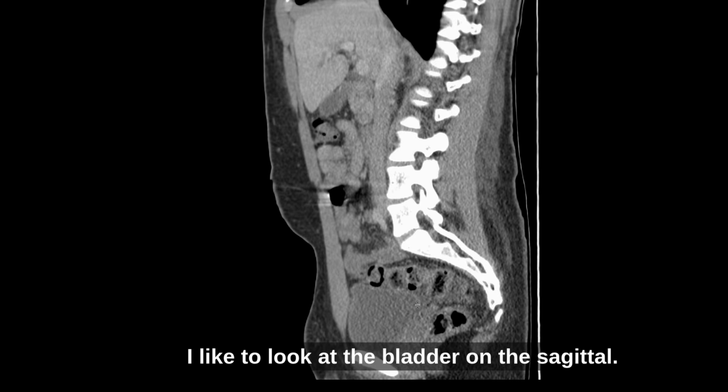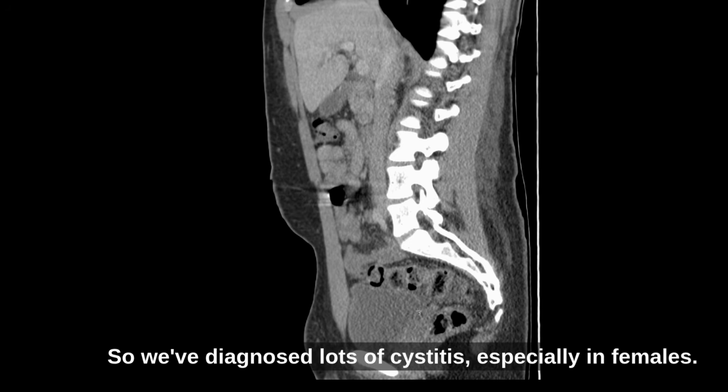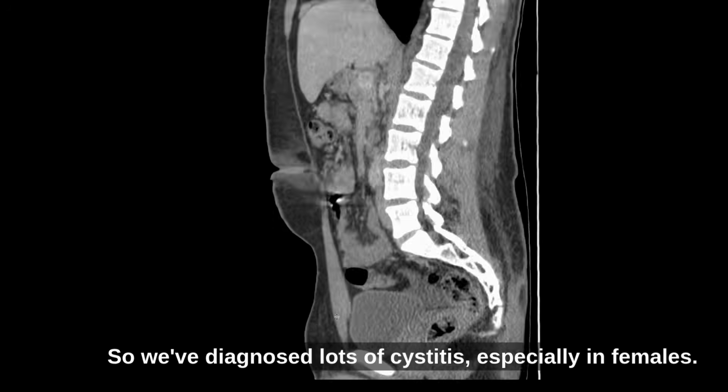There's our bladder. I like to look at the bladder on the sagittal, and I'm looking for thickening. So we've diagnosed lots of cystitis, especially in females.